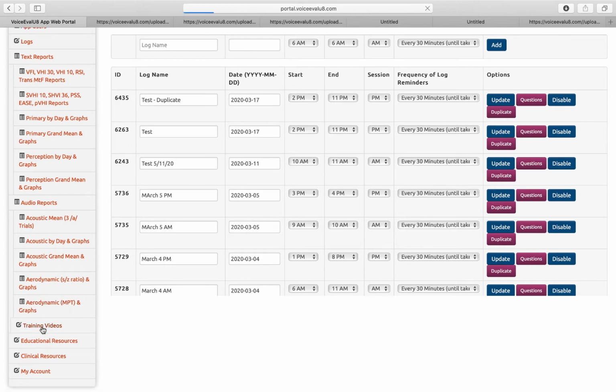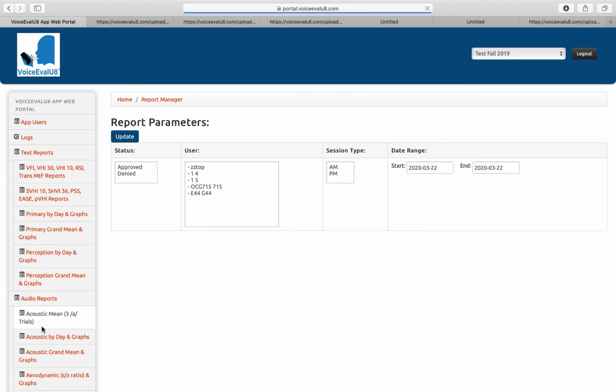Down here we have tabs where you can access training videos.